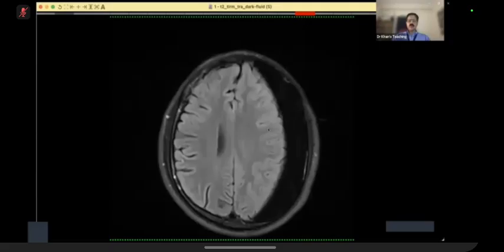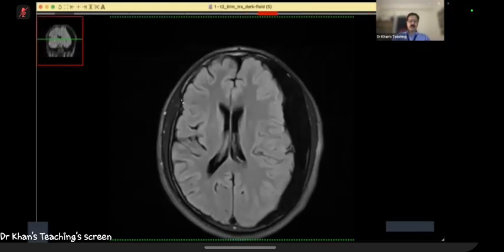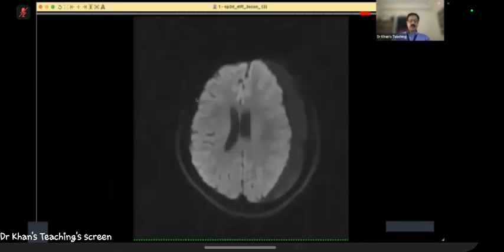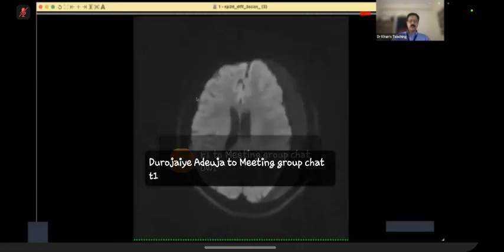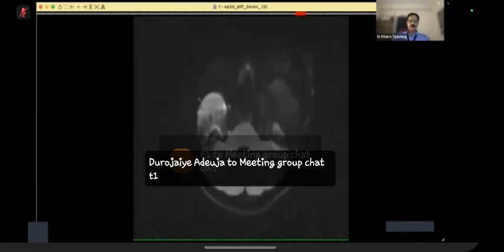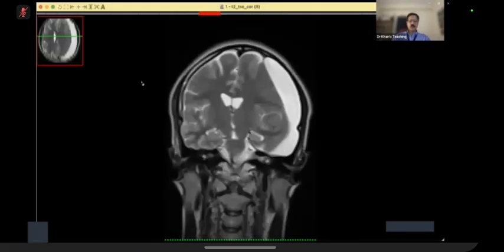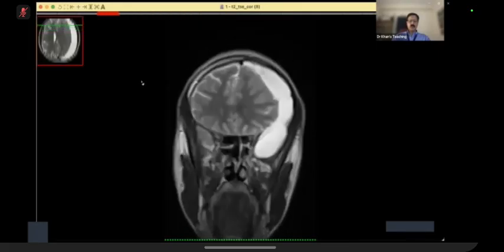Okay, so let me ask the chat. Chat is open. It is a question for anybody, everybody. You can participate as a group. Anything else you want to see? DWI. So this is the DWI. And I'm going to show you a corona. So this is a corona.